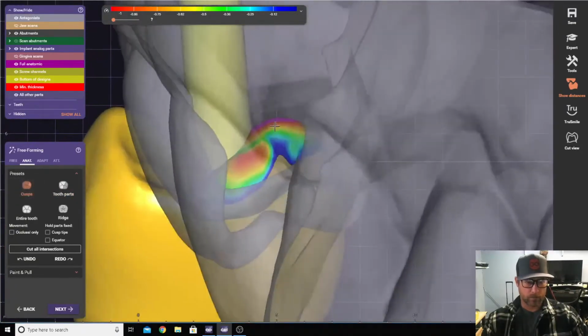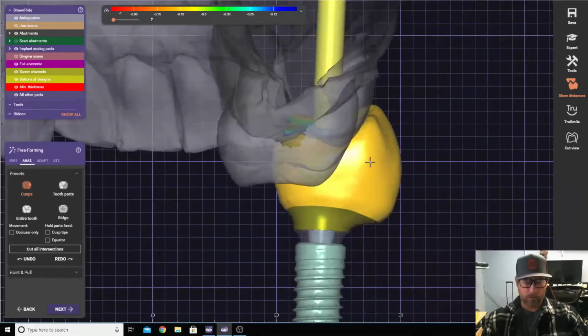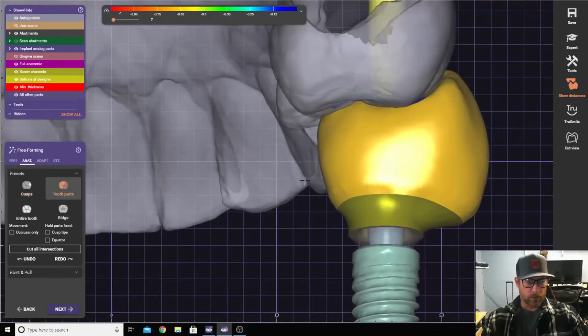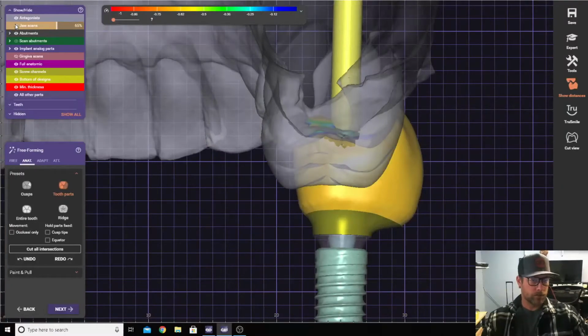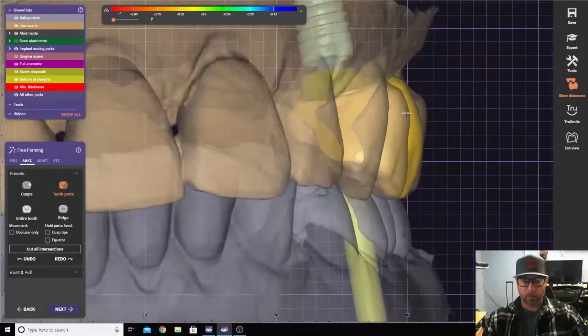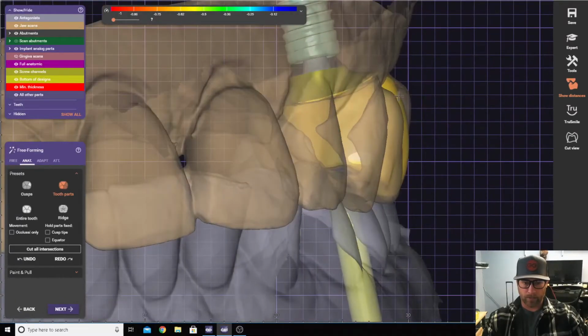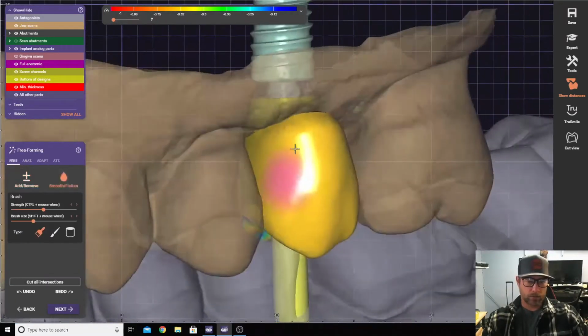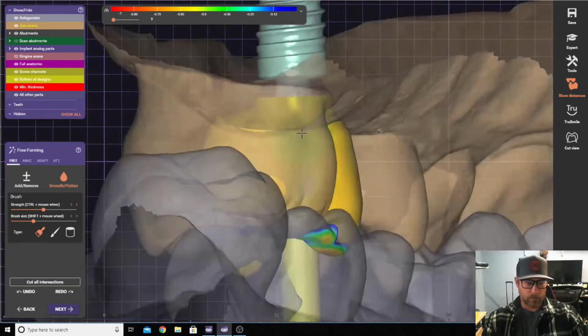It gets that stuff out of the way, and also you can see if you're too bulky in the lingual, way easier than if this crown's in the way. You can see here. So these are the kind of things I like to do, and then down the buccal corridor, I'll bring the cast back, and we'll just smooth out these little areas right here. Good to go.